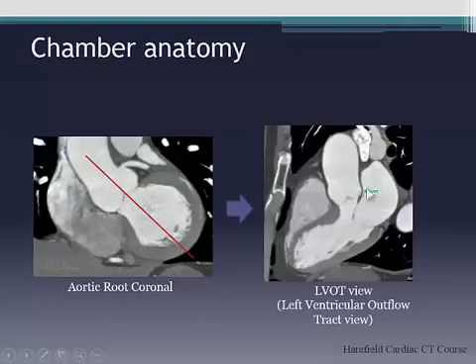Okay, so that gives you basically a fake three-chamber. Remember, this is not a proper three-chamber simply because you've not planned it properly, i.e. you've not planned it off the LVSA. But it's quite a quick way of giving you roughly what a three-chamber should look like. And then that can be helpful because it gives you a rough ballpark figure for whether the left atrium is enlarged. So again, a lot of the measurements that we use in CT, in the same way as the measurements that we use in MRI, they're all derived from echo. So that's why it's helpful for you guys to use the same planes that you're used to seeing on a day-in, day-out basis if you're using echo, because the relationships are pretty much fixed in your head, and you'll say, oh, that left atrium looks big, and you don't even have to measure it, right? Okay.